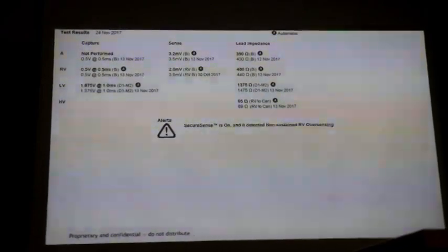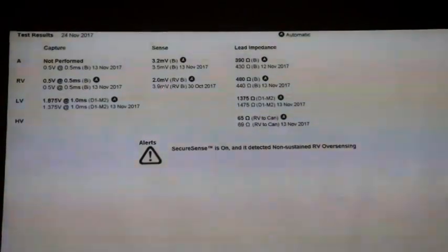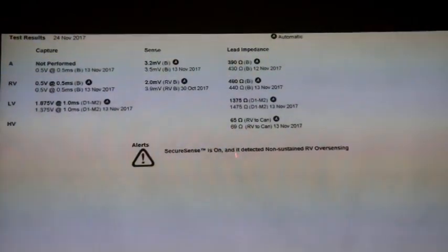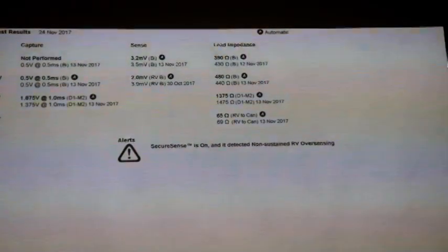Okay, another case study. These are all ICDs, right? It's an ICD case study. The R wave is very low, and it's decreasing a little bit. Thresholds are normal. Impedances are all normal. Nice high LV impedance, which is good, keeps the longevity of the device up.